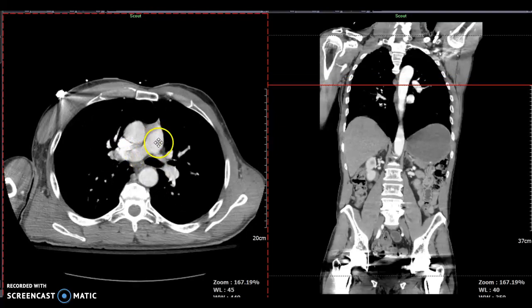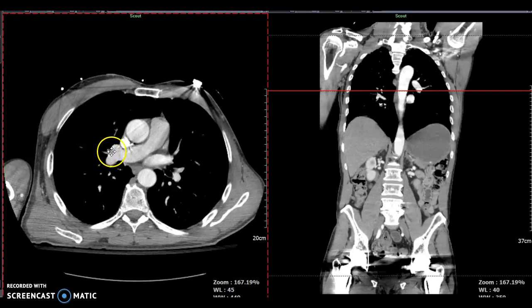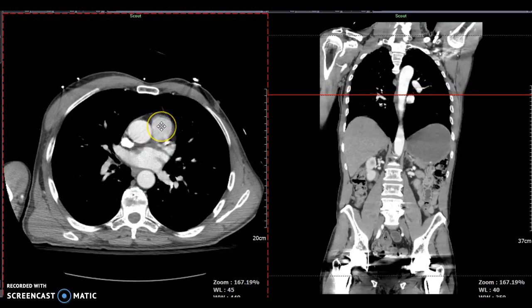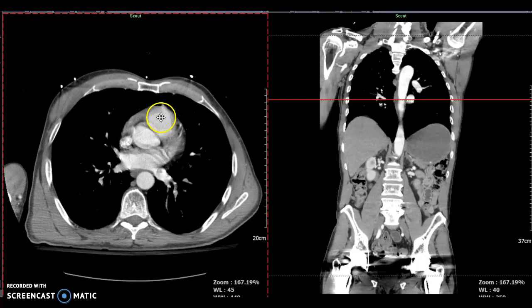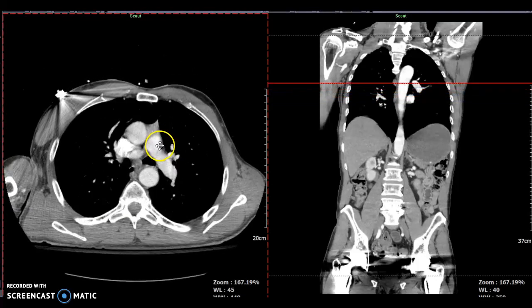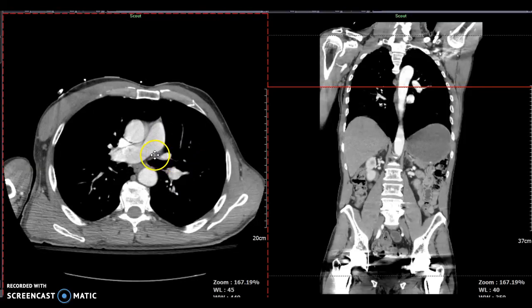pulmonary artery that goes underneath it, like a car going under a bridge, feeding deoxygenated blood to the lungs for oxygenation. This is your pulmonary trunk right here, coming from the right ventricle. And then this right here, this is your left pulmonary artery going to the left side of the lungs. Those are all structures you need to know.